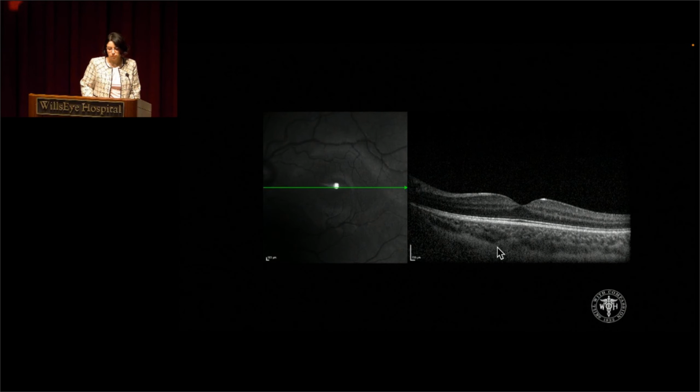Similar imaging modality in the left eye. It's a little bit more attenuated here. Don't really see the infrared that much, but essentially normal architecture here. Foveal contour is normal. Choroid looks normal. No media opacity. It looks optically clear overall. Unremarkable scan on this side.